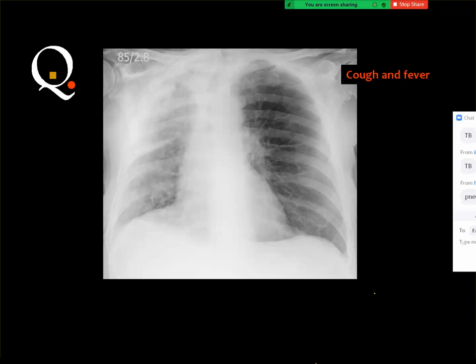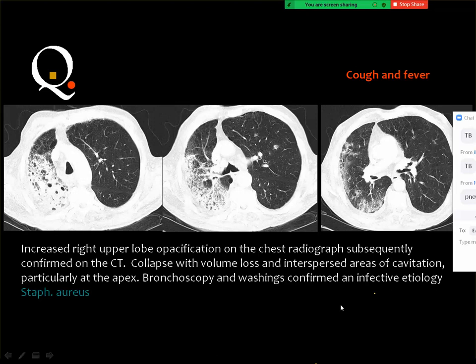Yes, and this is pneumonia. I intended to provide this case because you know that all patients are extremely oriented by COVID, and many of the cases diagnosed as COVID are not actually COVID. They are pneumonic consolidations due to any other organism.